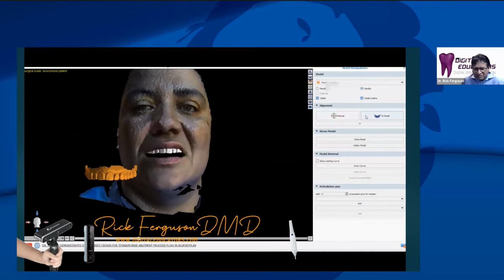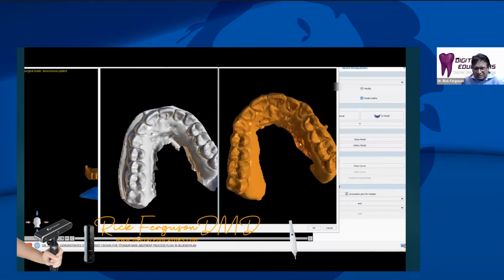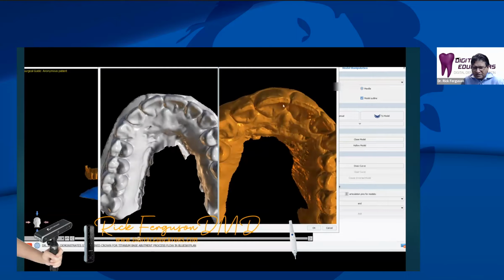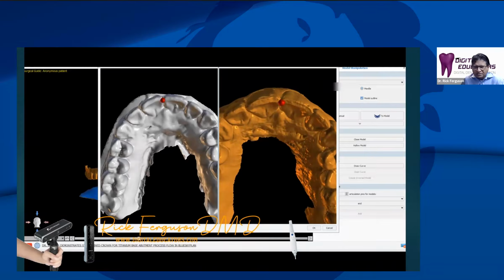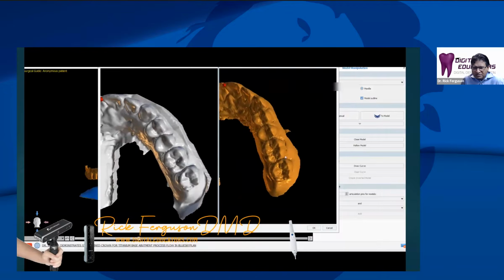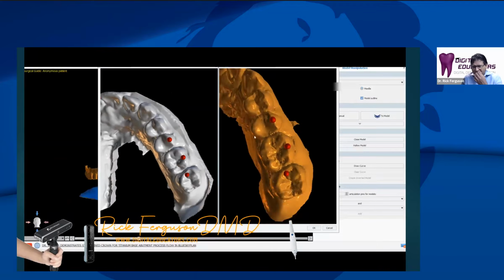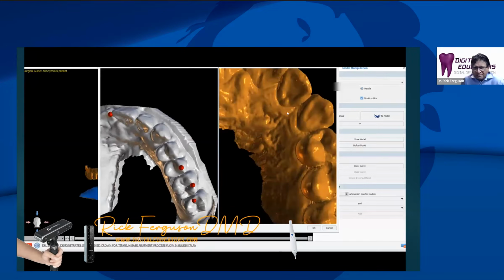And again, those teeth are an impression of the patient's actual teeth. Of course, with an impression technique, you're going to lose a little bit of detail compared to an intraoral scan. So we can actually bring in an intraoral scan. The orange model you see there is an actual intraoral scan directly from the mouth. And you can see we have a little bit more detail, right?